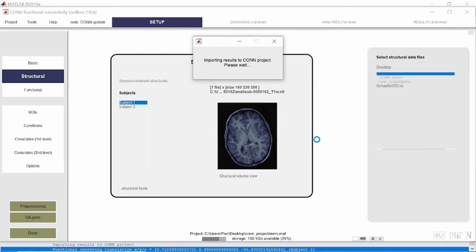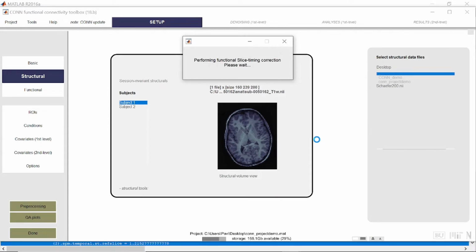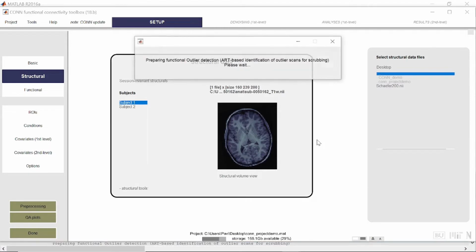So now note number 1. The steps and the parameters that we show in this video demonstration are the steps and the parameters that we used in our paper, and please be advised that this is not the only way to do it.